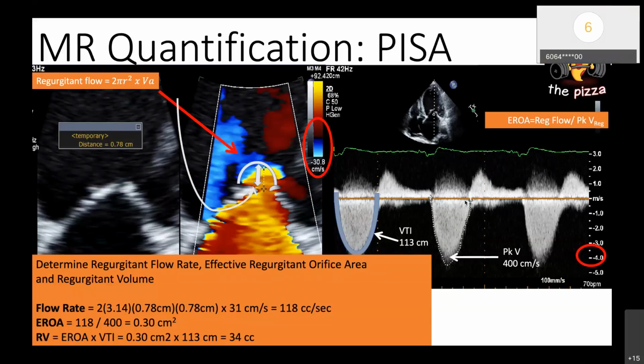Yeah, so why is that? Can you explain that to the group, Des? I mean, I can try. I would think it's just the pressure equalizing maybe. That's what happens whenever you have severe TR, eventually the pressure is equalized and you have a triangle-shaped jet, but not as high a velocity, and a very thick waveform.